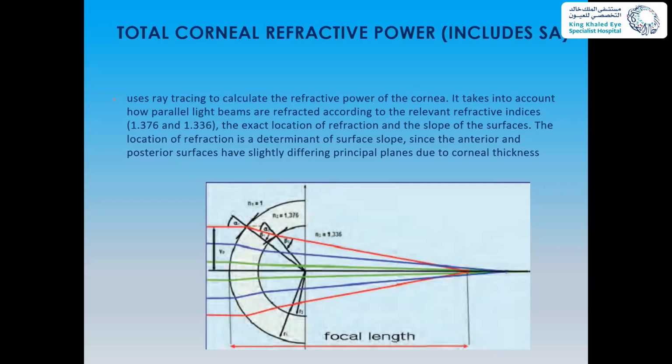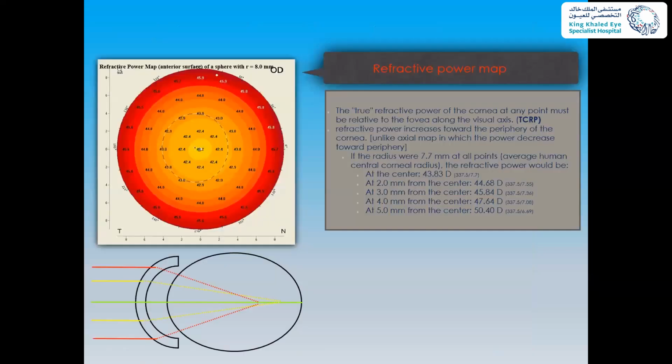Many of these new IOL calculation devices for previous LASIK want you to have this total corneal refractive power.